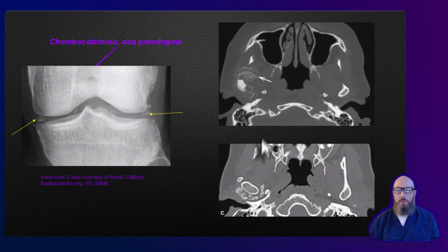And so I have these two different images, axial slices through the temporomandibular joints. The right joint is affected in both. Here's your right condyle, nice smooth outlines. Maybe we don't see all of it in one slice, but nothing about this shouts to me that there are degenerative changes. And I see these small islands of bone or pebble-like calcifications within the joint space, contrasted to this one, where it's more of a diffuse, almost a ground glass or maybe a cloudy appearance of the calcification.